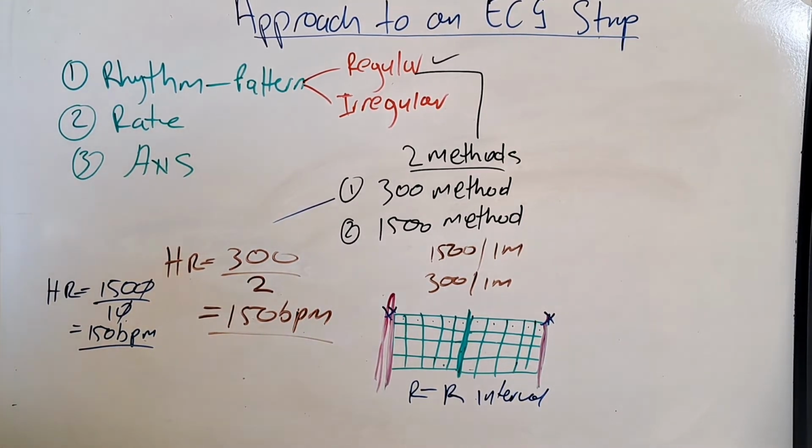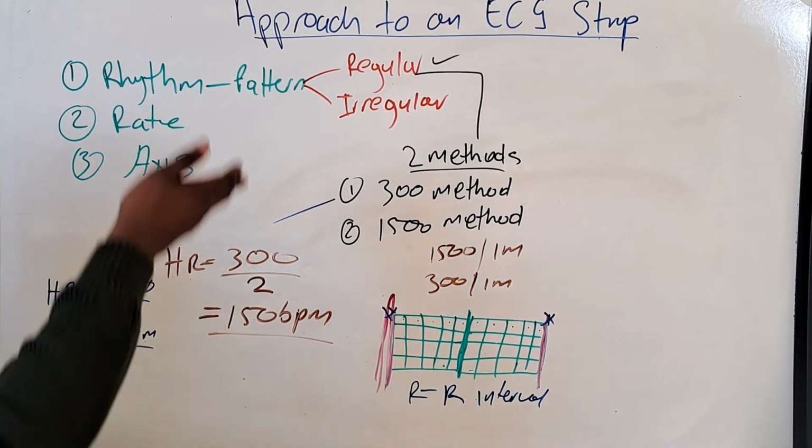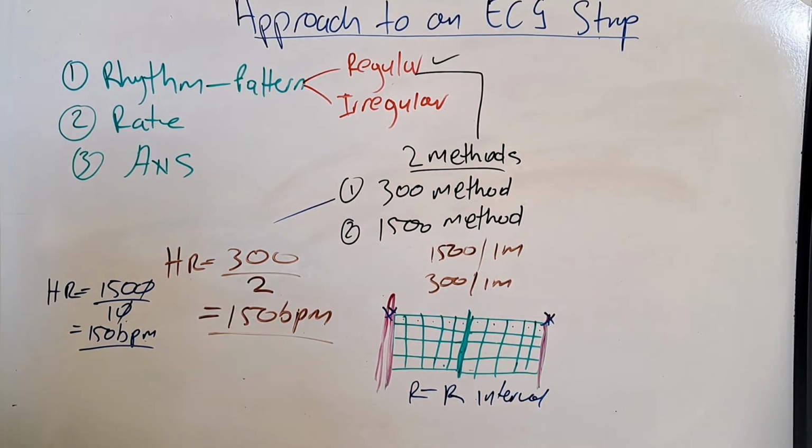So it doesn't matter which method you use between these 2, as long as your heart rate is regular. As long as the pattern is regular, you can use either of the 2.